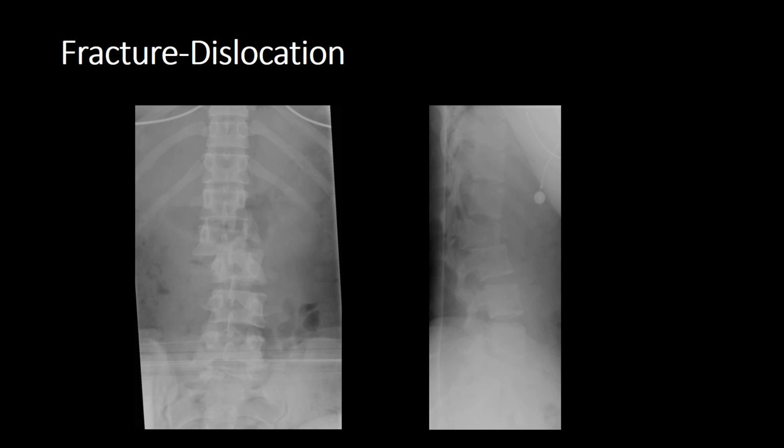Fracture dislocation is a really significant injury. If you can remember, the spinal cord terminates at the L1, L2 interface. On this particular patient, the injury is at L2, L3. And so if the cauda equina is completely transected, what's going to happen is that you're going to get disruption to the brain-leg interface. And that will include your thighs, your groin, your hips, and it may even affect your anterior abdominal wall. So let's have a quick look at this patient.